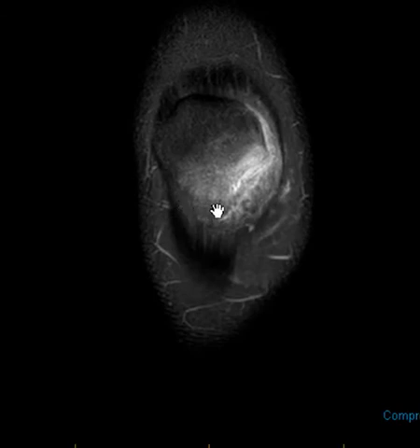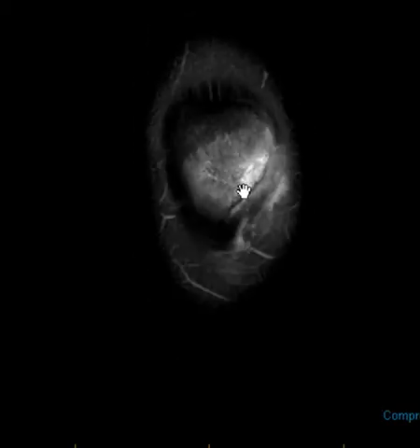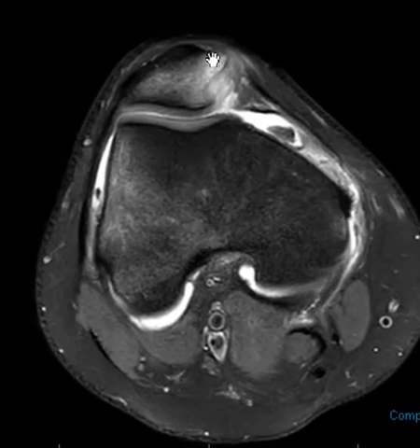This is the patella. The superior and lateral contours are normal, but look at that inferior medial contour. It's, again, impacted. The bone is impacted with underlying marrow edema, and we can see this best on the axial sequence. So the next is the axial sequence. We can see the patella up front. We can see the defect of the patella.